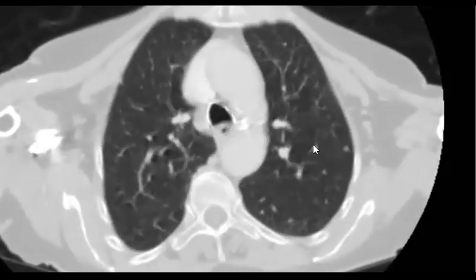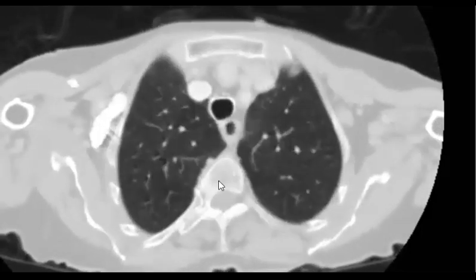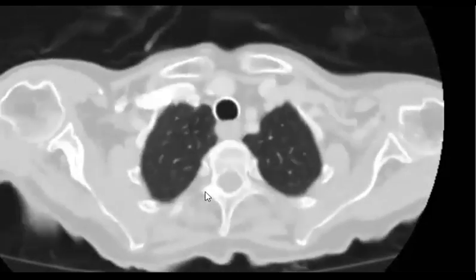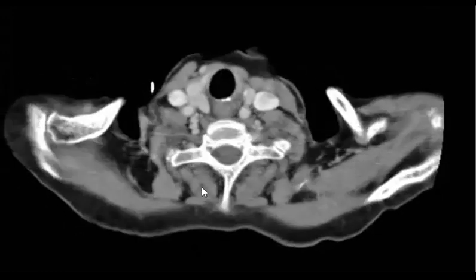And you can see that there is one nodule here, and one pulmonary, maybe subpleural nodule here, and another one, but it's calcified. Do you see them well? And here, okay, so there are some pulmonary nodules. Do you agree with this?